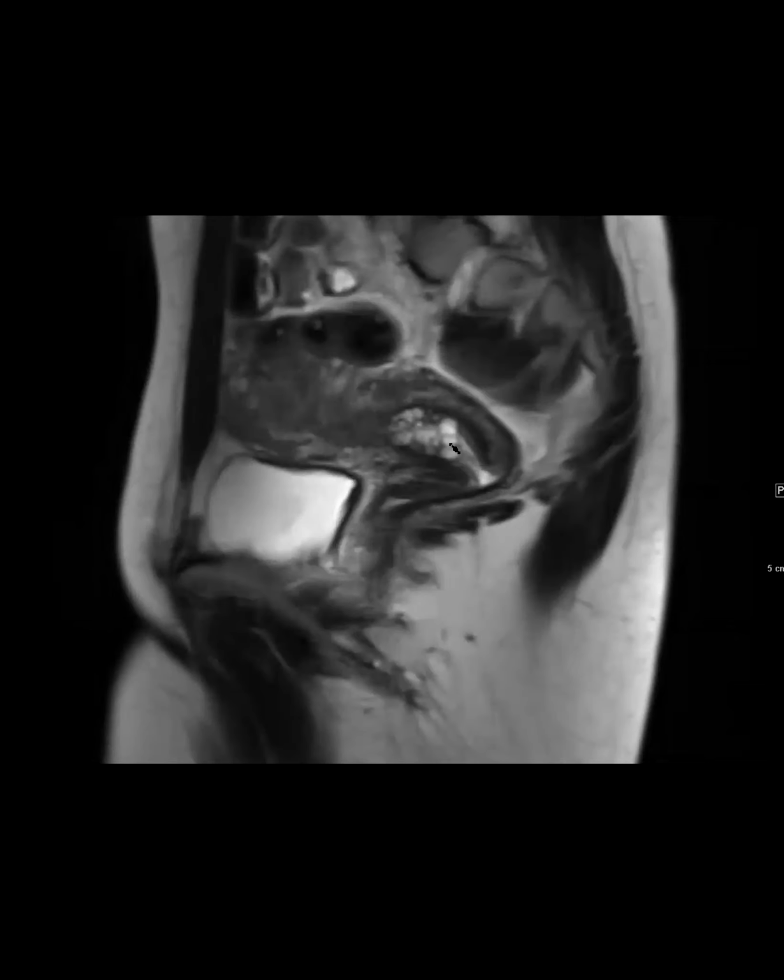And just as a companion case, here's a patient that's a more classic tunnel cluster where you've got a bunch of more simple Nabothian cysts. This was also resected and turned out to just be Nabothian cysts. So there can be an overlapping spectrum, but when it looks more simple like this, it's statistically usually Nabothian cysts, much more common.